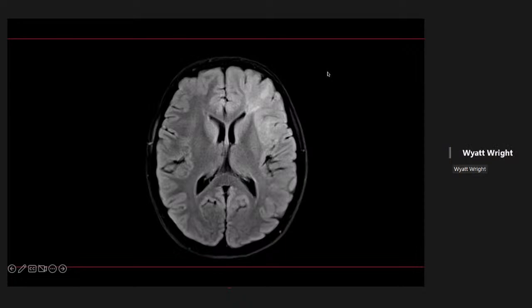Let's see. So the gray matter looks lighter than the white matter, and the CSF is dark. So I think this is FLAIR, maybe? You got it. Yeah, this is a FLAIR. Okay, so are you seeing the asymmetric abnormality in this patient? Yeah, so it looks like anteriorly on the left, in the white matter, it's a little more hyperintense compared to the contralateral side. Absolutely.